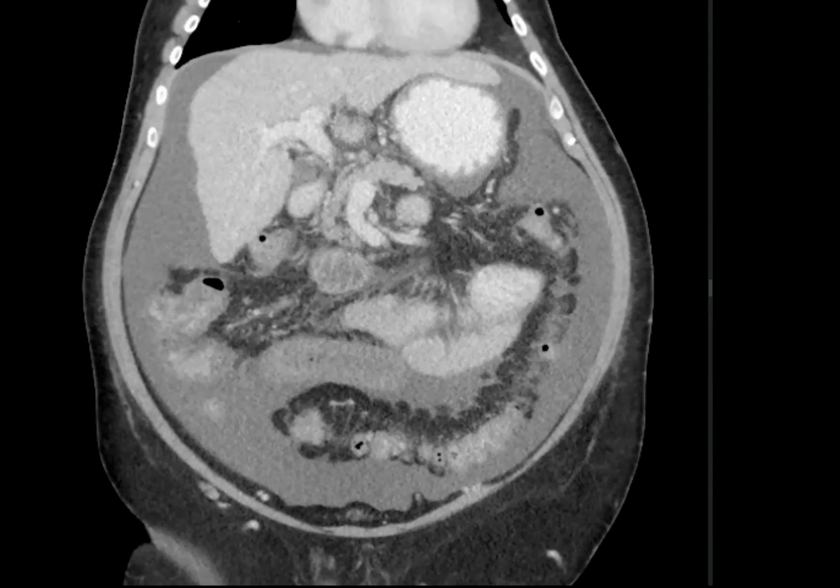I think the biggest takeaway from this case for you should be to have a list of absolutely critical emergencies that can come up in any exam. So abdominal CT, what are the 10 things that you absolutely cannot miss? And make sure you tick them off in your brain before you think about other less likely possibilities. So under vascular, you absolutely must always look for arterial or venous or other kinds of vascular problems.